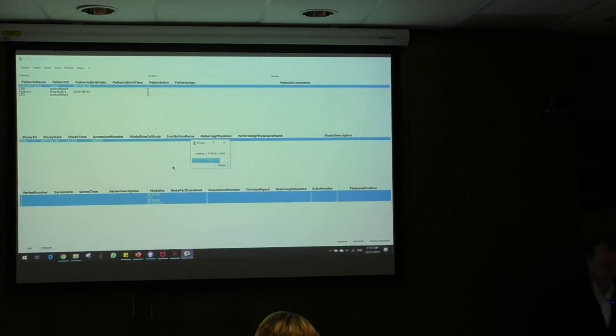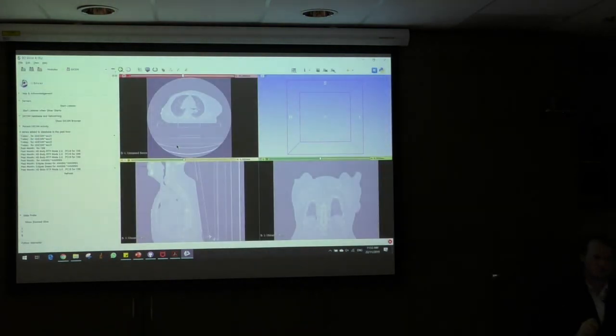And now I'm going to talk about the contouring aspect of 3D Slicer and how it's a little bit different to conventional treatment planning software. So with treatment planning software, you'll conventionally go through slice by slice, contour different regions of interest. With the inbuilt function in 3D Slicer, I think it's going to freeze again.